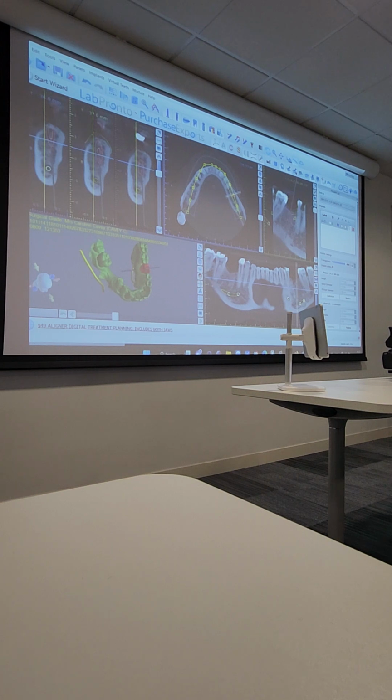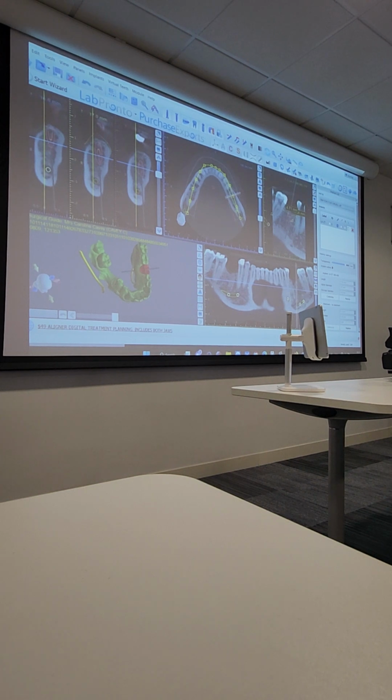I just want to measure the distance on my implant, and we've got a lot of space here, but I want to check that. Once you get the measurements, right click on the millimeter number it's giving you. Sorry, you need to come out from the ruler and then right click and you can delete them. There, remove.